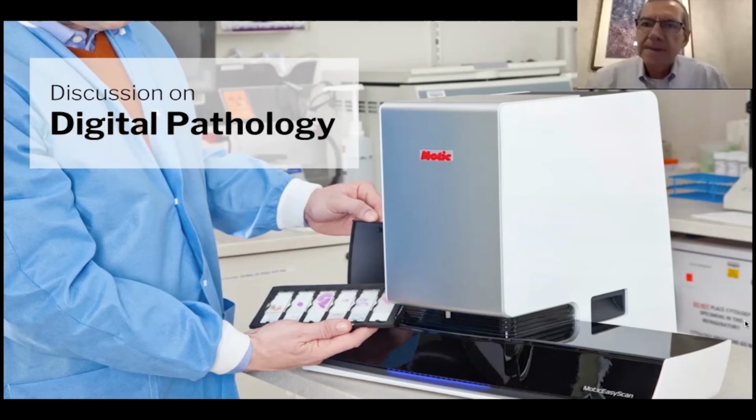Well, as you know, we are a group that covers different hospitals. Some of the hospitals are small enough that they cannot have a full-time pathologist. Still, the patients there require full-time attention, if you will. So let's suppose that a patient needs a biopsy. You would have to schedule a pathologist to go there and assist in the biopsy, meaning either adequacy or doing a frozen section.